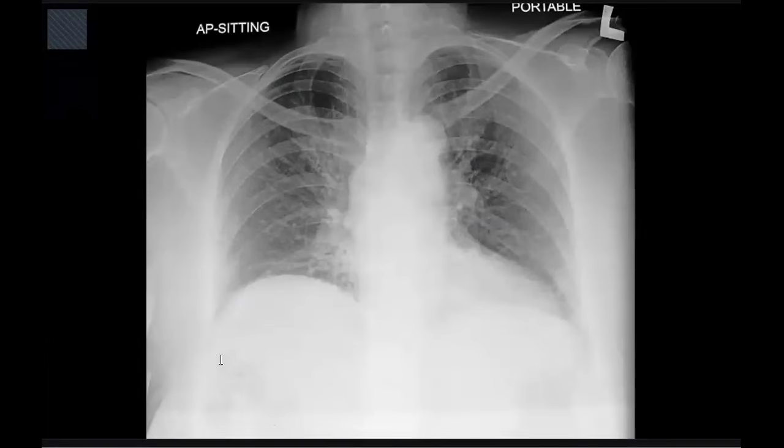What are you suspecting? I'm suspecting a liver abscess. If the patient has right hypochondrial pain, I would like to take a history of any fever. There is also some hyperdensity within it. So I would like to further proceed with a contrast enhanced CT scan of the chest, abdomen, and pelvis.